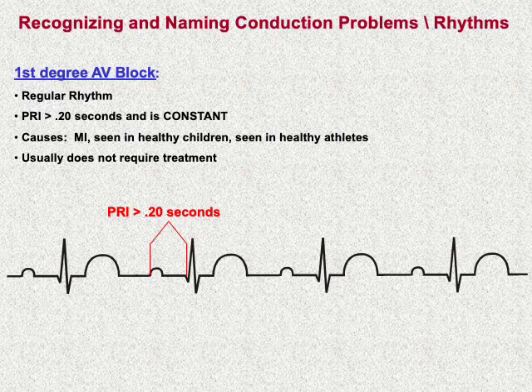As regards disturbance of the cardiac rhythm, we have tachycardias, and we also have bradycardias. We have what's called AV block, or block usually occurring at the level of the AV node. In first degree heart block, the AV node becomes diseased, so the conduction is prolonged. As we see, the PR interval is lengthened to more than 0.2 seconds. So if the PR interval is more than 5 small squares, this is first degree heart block, and it usually does not require specific treatment.